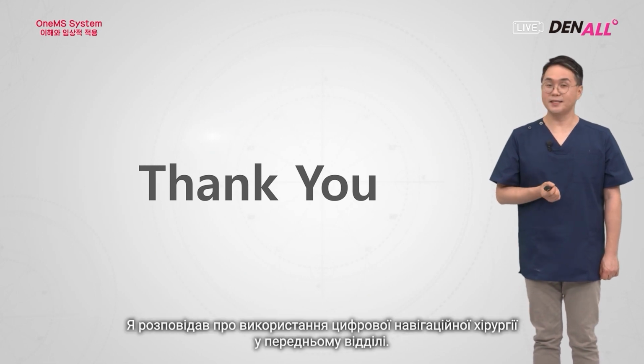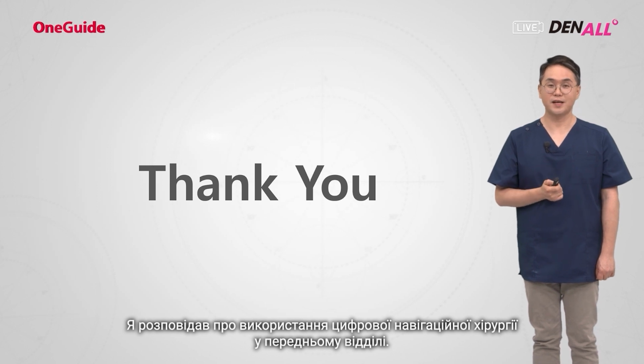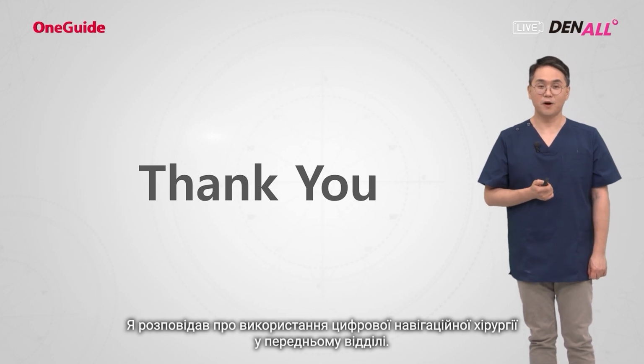Now, up to now, I looked at how to use the digital guide surgery system on the anterior part.